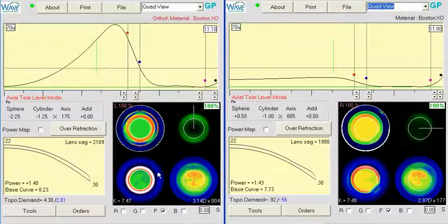So in a case like this, I didn't change it here in the video, but I think it's perfectly fine to design this lens in G-SIM. It'll still fit really well, and it's easier to troubleshoot a G-SIM lens than a freeform lens because of its increased complexity.